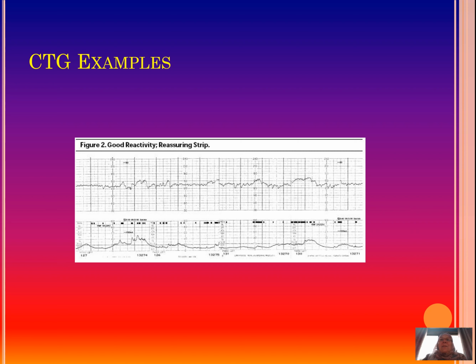The last acceleration, which is a little bit longer, if you go down and look at the stripe where the monitor records the fetal movements, you can see that this longer acceleration is actually associated with more fetal movements. And this is very typical for accelerations.